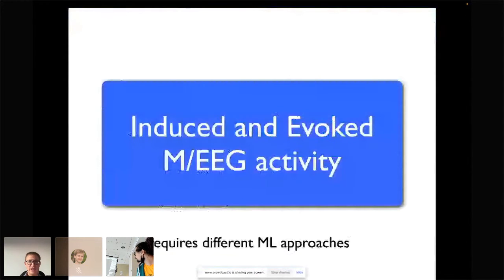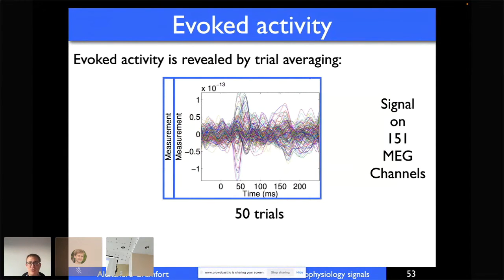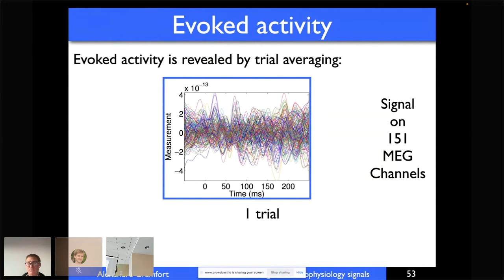So, induced and evoked MEG activity. The take-home message is: don't do time-by-time decoding if your signal of interest is induced. Evoked activity is illustrated here by this small animation. This is raw MEG signal, the continuous recording, with some low-pass filtering, so it's a bit smooth.